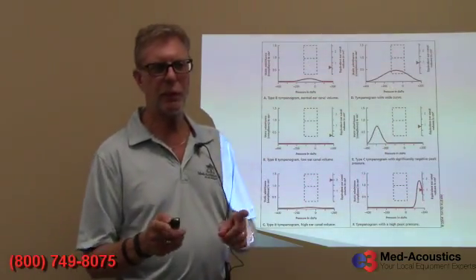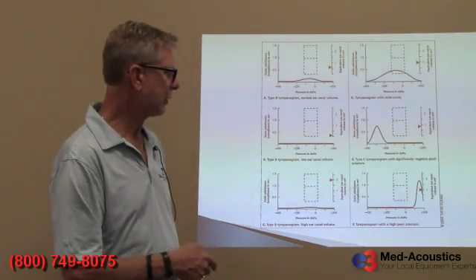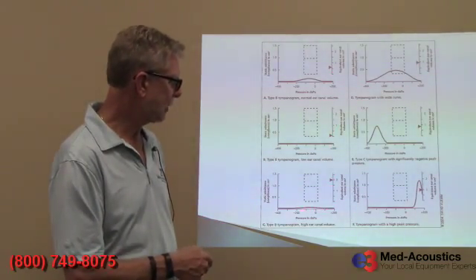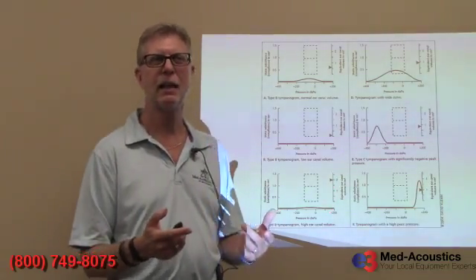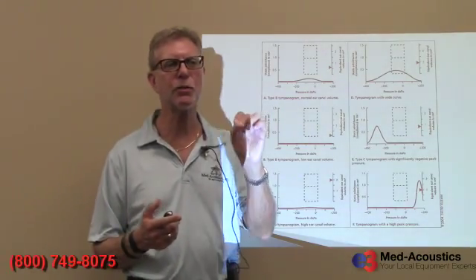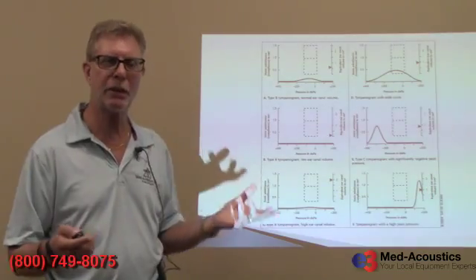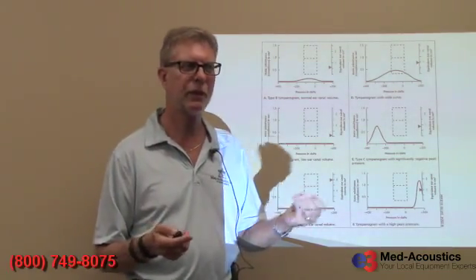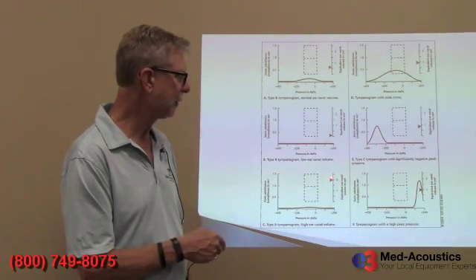Another thing that's important about the tympanogram is the volume measurement, the ear canal volume measurement. If you had a flat tympanogram like this and a very high volume rating, you would suspect that there is a perforation, a hole in the eardrum. Maybe it's a myringotomy tube that is not occluded, that's working properly. So you'd expect a higher than normal volume.